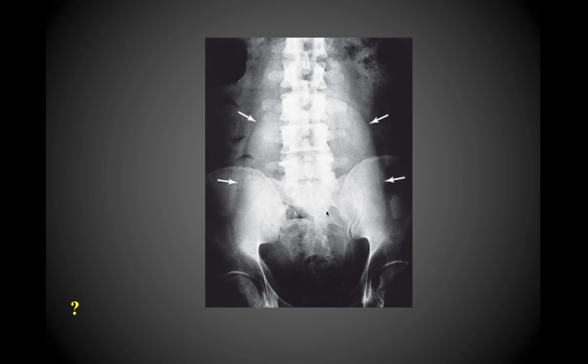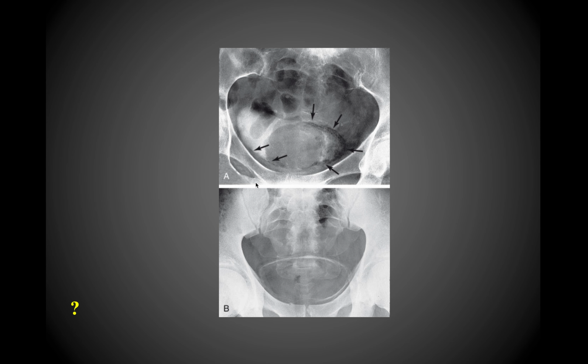In this patient, you see a good example of a highly distended bladder. The bladder does have a significant ability to distend, including all the way up into the abdominal cavity, but this is a relatively extreme example. You might think this is an abnormality or a tumor in this patient, but indeed this is just the bladder highly distended in this individual.